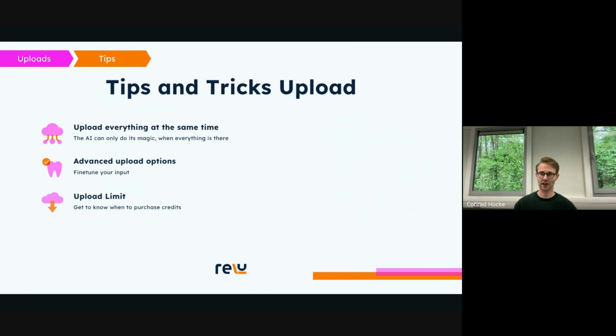Let's take a quick look at our upload limits. I have gotten many questions in the past about how many uploads a user still has left, because some people pretty quickly run into our upload limitations. We allow you to upload 5 scans for free to test our AI models. But then we ask you to activate and therefore pay for every 5th scan. We have to do this to have our server infrastructure running, to pay for the running costs of it.